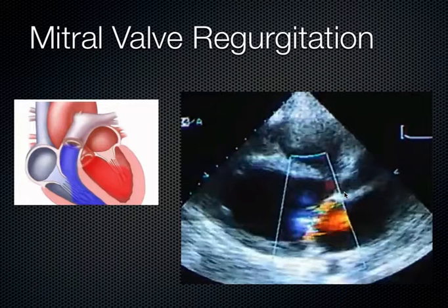Now, this is an example here of the parasternal long axis, just to demonstrate where that mitral valve is. And one of the things you've got to remember about Doppler, it's a little bit confusing initially, but you've got to commit this to memory, is that when you work with Doppler, you can't have the Doppler assessment at 90 degrees to the angle of the sound.